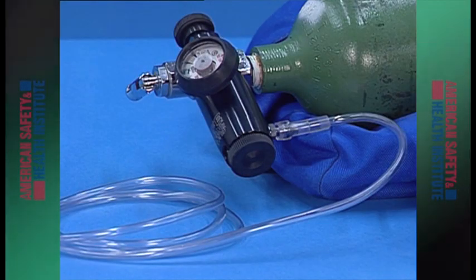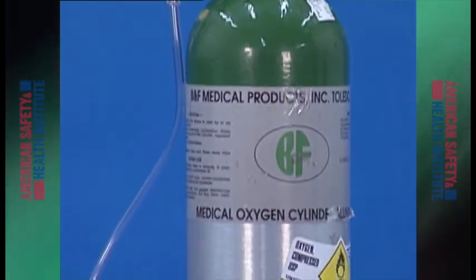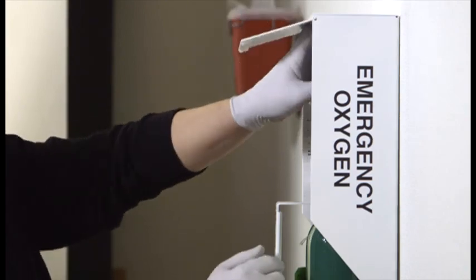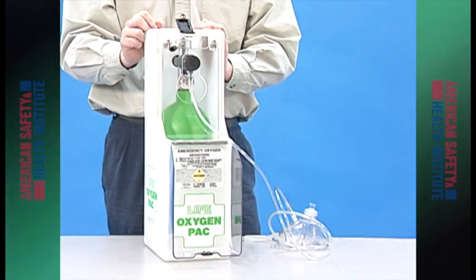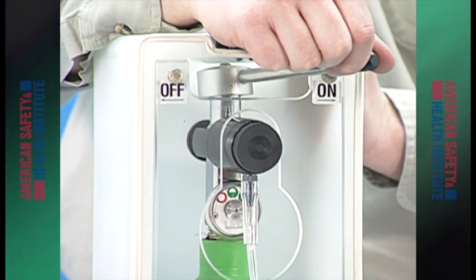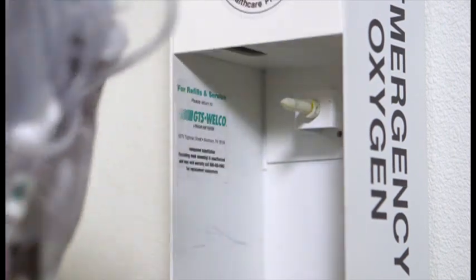Although all emergency oxygen delivery systems include the same basic features, individual systems may have other unique features to consider. Some systems automatically begin the flow of oxygen once dislodged from their storage case. A pre-connected ventilation mask ensures a unit is ready to use in an emergency. Other systems are designed with a fixed flow regulator, so you simply move a lever to begin oxygen flow. Rugged cases can protect pressurized oxygen cylinders from being damaged.